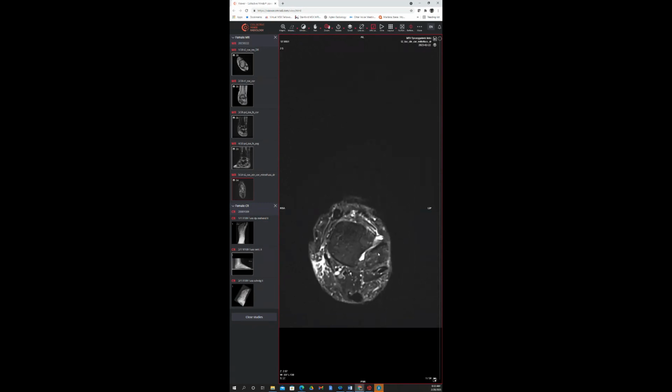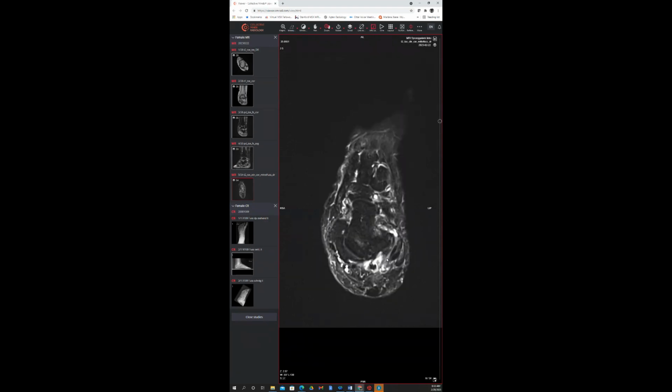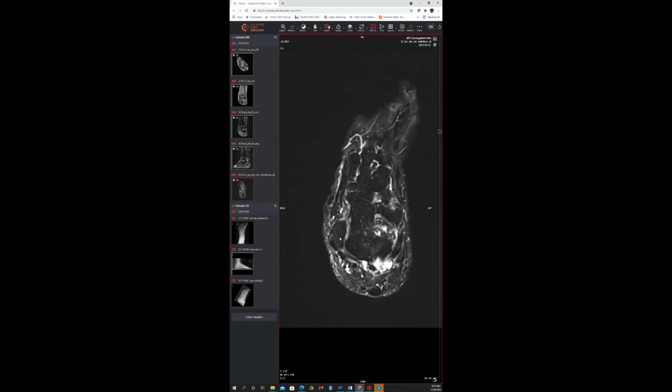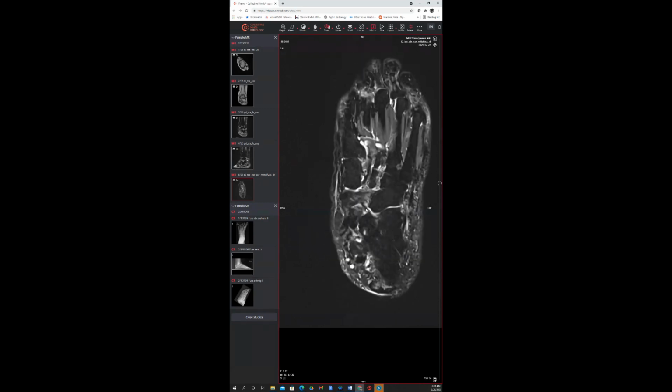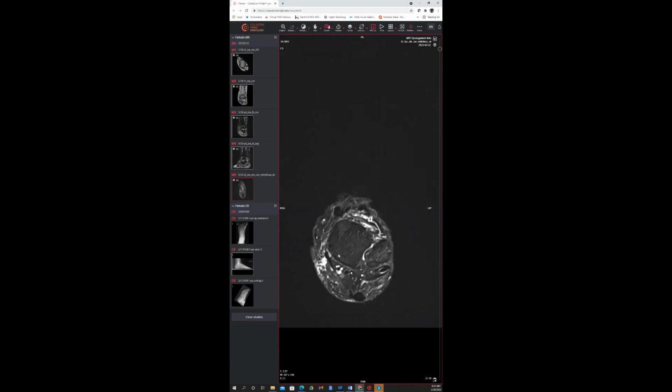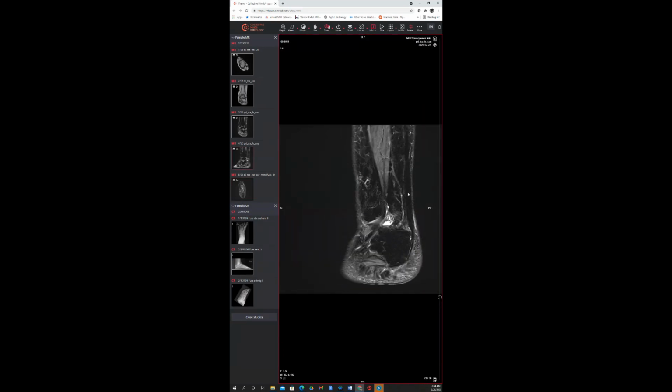Looking at the region of the syndesmosis, slightly stretched here, posteriorly intact, interdigitating, showing its altered biomechanics. ATFL thickened, PTFL mildly sprained, calcaneofibular ligament sprained and mildly thickened with synovitis in this region. The deep deltoid, the superficial deltoid, and the regions of the spring ligament, mildly thickened, not a lot going on. Looking at the Achilles tendon itself, mild tendinosis, thickened here, trace retrocalcaneal bursitis, thinned at its insertion.